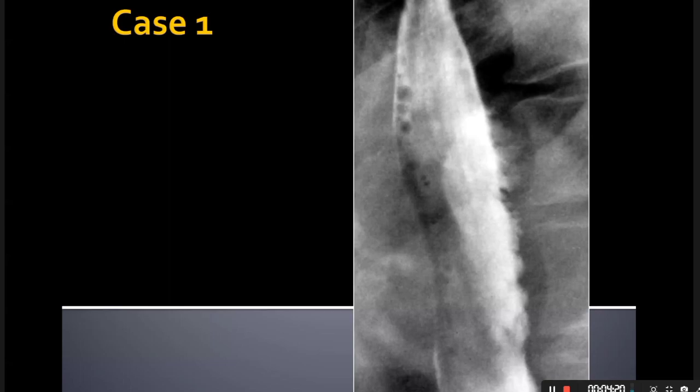I would say... Have a stab. Doesn't matter if you get it right or wrong. Okay, I would say we look at the strictures because of the lye ingestion. So I'm thinking if there's any corrosive intake, would it be related to any lye ingestion? Okay, all right. That's fine.